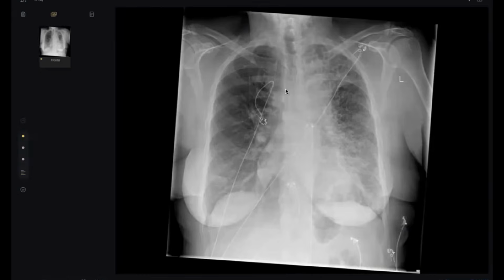One of the most important causes of unilateral reticulation: number one, contralateral transplanted lung with ipsilateral ILD, interstitial lung disease. Number two, edema, but the heart here looks normal. Number three, lymphangitic carcinomatosis. If the examiner gives a case like this and only tells you dyspnea and you enumerate the different causes, you are right and you will be happy.